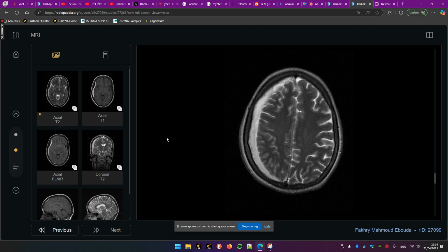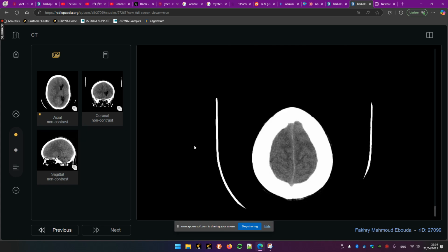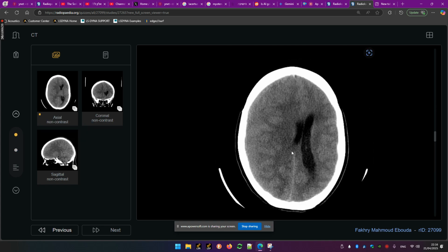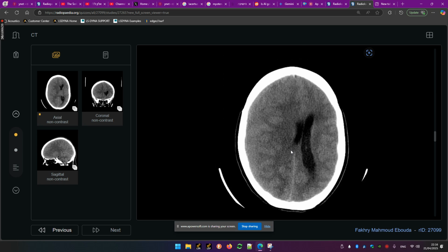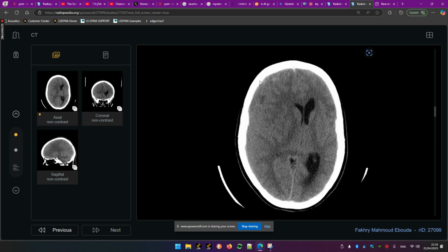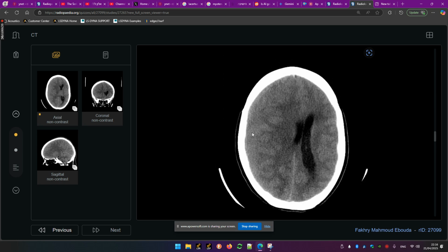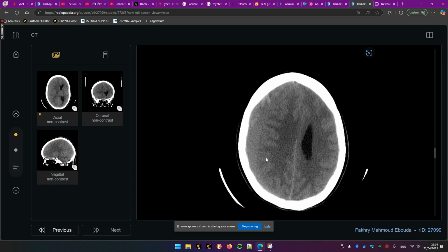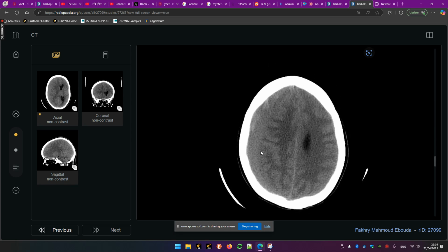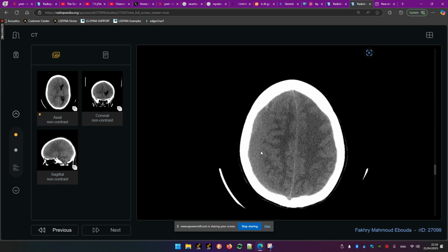Thank you very much. This was it. This was a very perplexing case of subdural. The important thing to take away is that subacute subdural hematoma, or any hematoma in the subacute stage, may be isodense to the brain parenchyma and therefore be easily missed on CT.